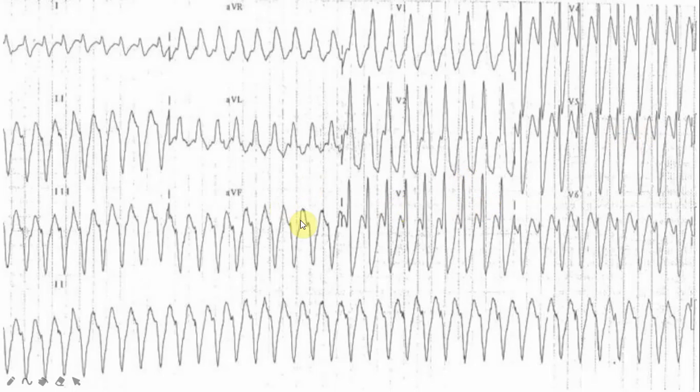So my diagnosis will be that probably this is highly likely to be VT. So another ECG which can be quite tricky to diagnose. So this is a wide complex tachycardia. QRS complexes are regular, can't see any P waves, so can't comment about the atrioventricular dissociation. There is probably a northwest axis, there is predominantly S wave in here and predominantly S wave here and the R wave here. So this is highly likely to be VT.